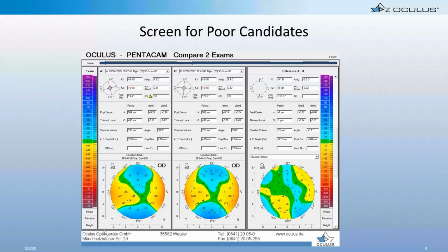And we can, again, look for signs of back elevation change, because really that's where we're going to see the signs of keratoconus showing up, right? We're going to see it on the back of the cornea more so even than we do on the front. So this allows us, even though we've altered the shape of the anterior cornea, we can look at the posterior cornea and do comparison measurements to look for signs of any type of ectatic disease.